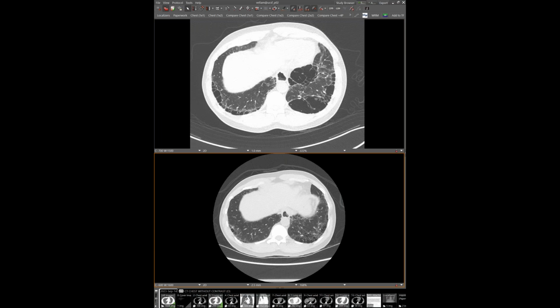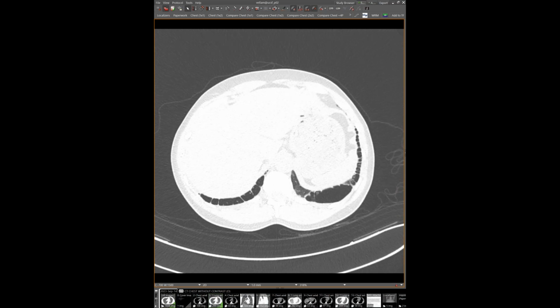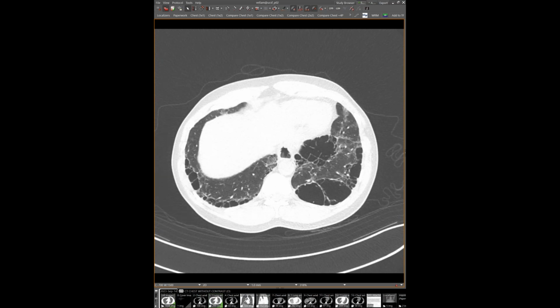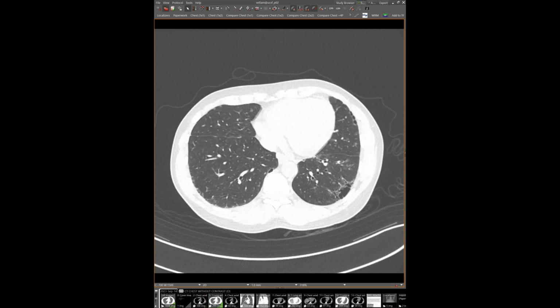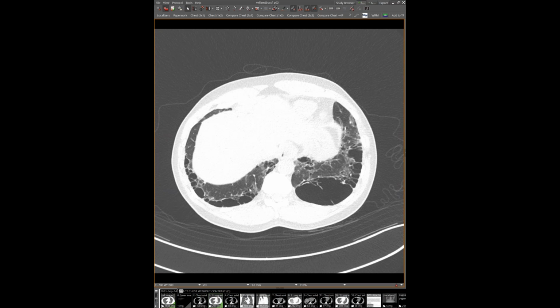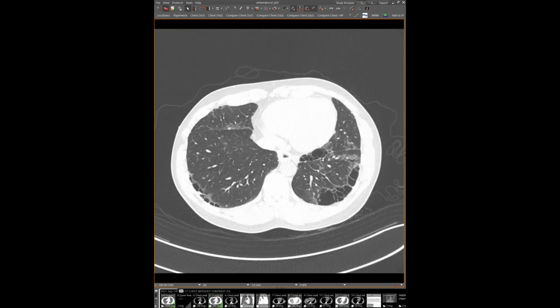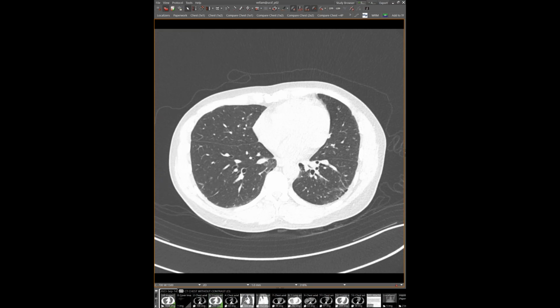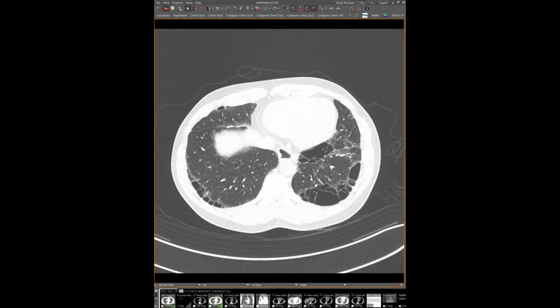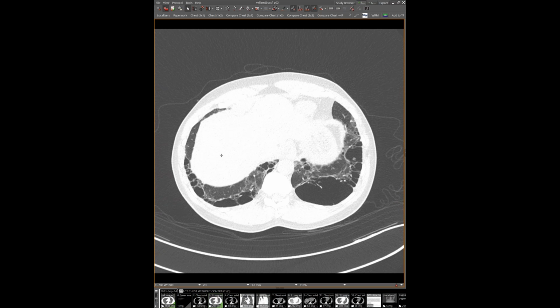And we can actually see the patient came back 5 years later and got another CT, and we see even more of these really extensive areas of cystic destruction at the lung bases with fibrotic rims to it. And some of that ground glass is still there, although there's less than there was previously. So again, the imaging looks to me like fibrotic or burnt out DIP, but with no smoking history, it's a little unusual. But this patient does have limited scleroderma, so has connective tissue disease.